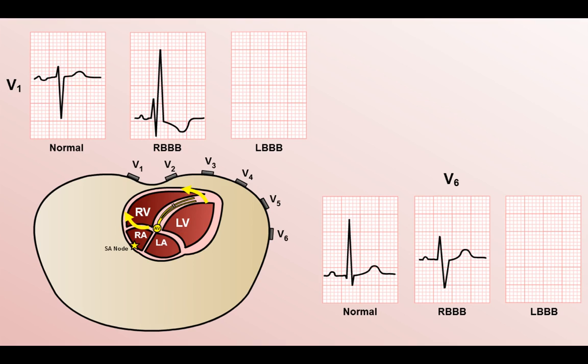Because depolarization of the right ventricle is inefficient and slow, as it's passing through non-conductive tissue, this final component of the QRS complex tends to be wider than the others, most evident in the wide terminal S wave in V6.